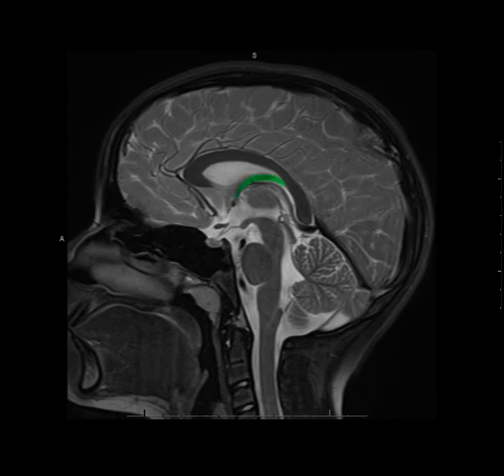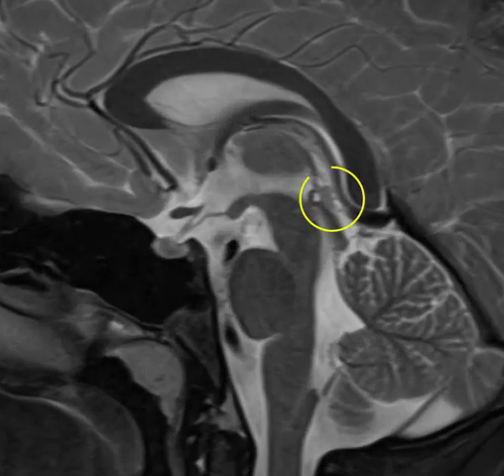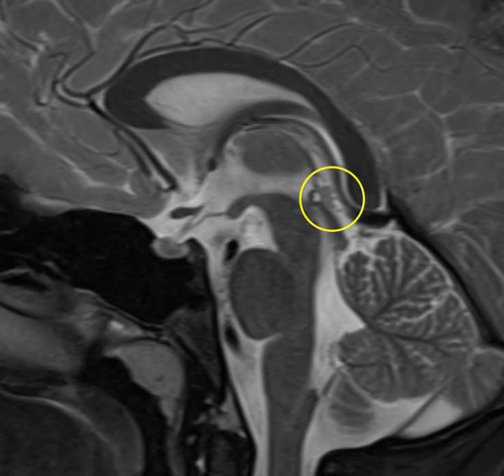The next structure we'll talk about is the fornix, which is a white matter structure, Latin for arch, which is part of the limbic system and connects the hippocampus to the mammillary bodies. It's very important in formation of memories. Next structure that doesn't really fit into any other good categories is the pineal gland, named because it resembles a pine cone. The pineal gland regulates circadian rhythms and secretes melatonin.